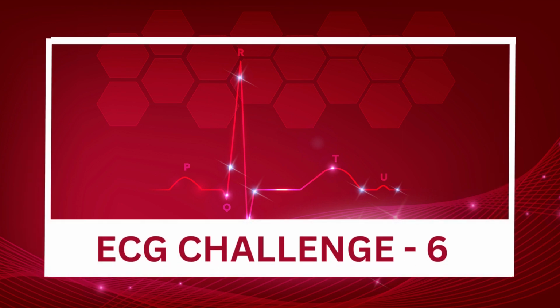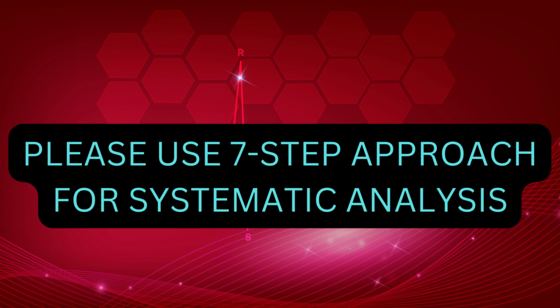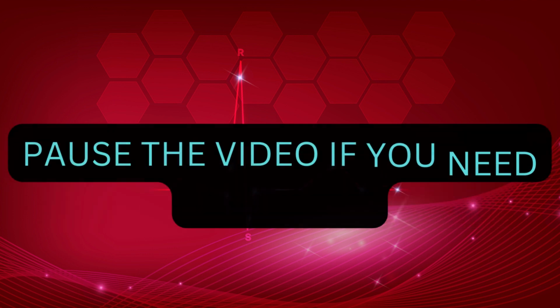Welcome to ECG challenge number 6. Please use 7-step approach for the systematic analysis. You will see many images of the same ECG. Pause the video if you need more time.